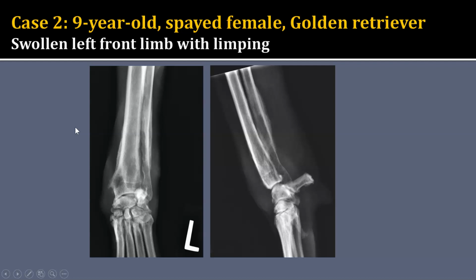And I think it would be highly unlikely that this would be something infectious, either bacterial or fungal. And certainly we cannot have a primary bone tumor on our differential list because there are at least 2 bones, if not another couple bones involved. So primary bone tumor should not be on our list. So really, my primary differential is going to be a soft tissue neoplasm causing this kind of irregular and mass-like swelling with secondary effects on the bone. And this indeed is a soft tissue sarcoma.